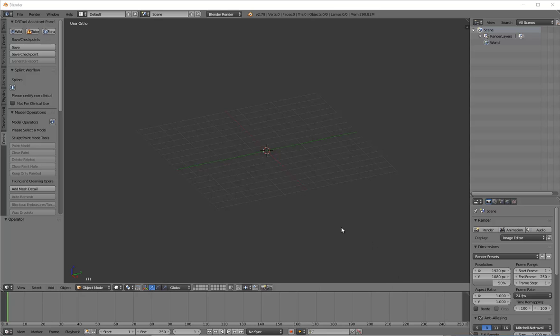Okay, so for this video, this is going to be my third design video in this series, and this video is going to discuss the actual Anterior Deprogrammer, which in some regards is the simplest, and in some regards is, well, I think it's the simplest design. So I'm going to go ahead and jump right in.